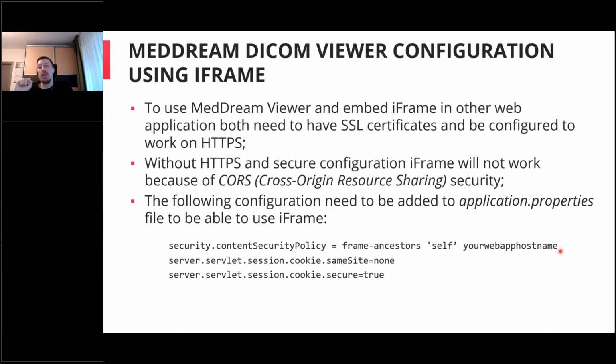Then you could have it embedded, and it will be displayed without any problems, even with the URL integration by token or simple URL integration. And again, if you have any questions regarding this, just let us know, and we can connect and configure everything together.